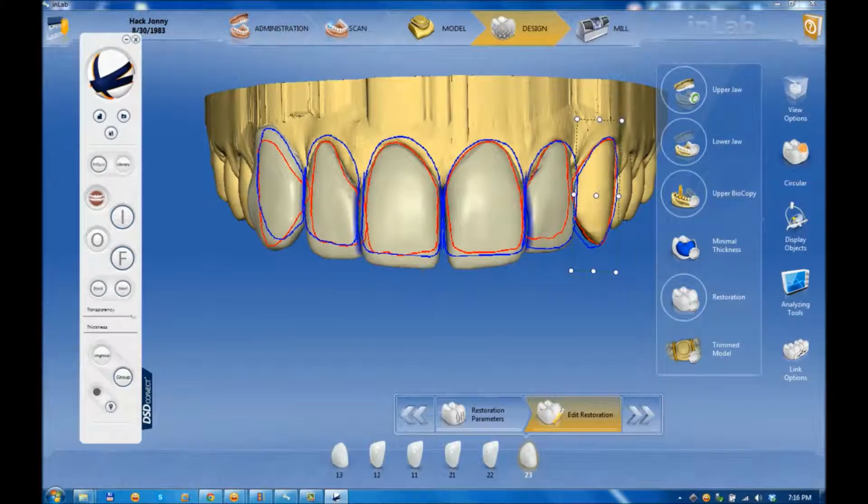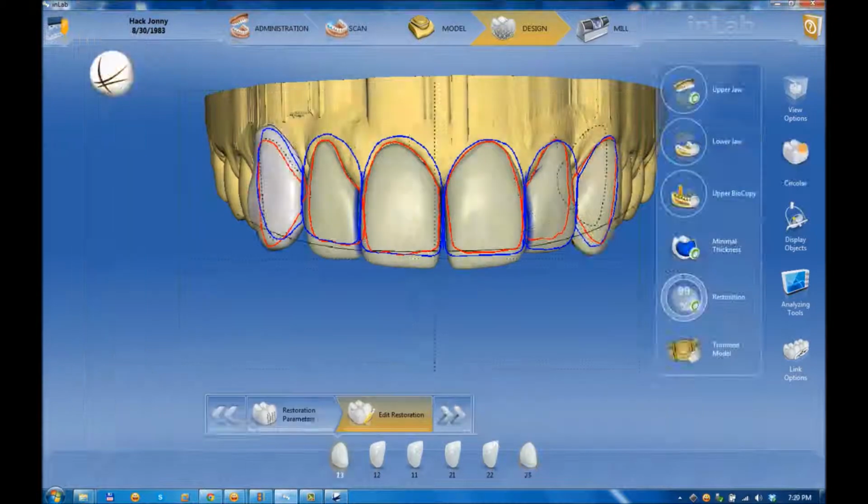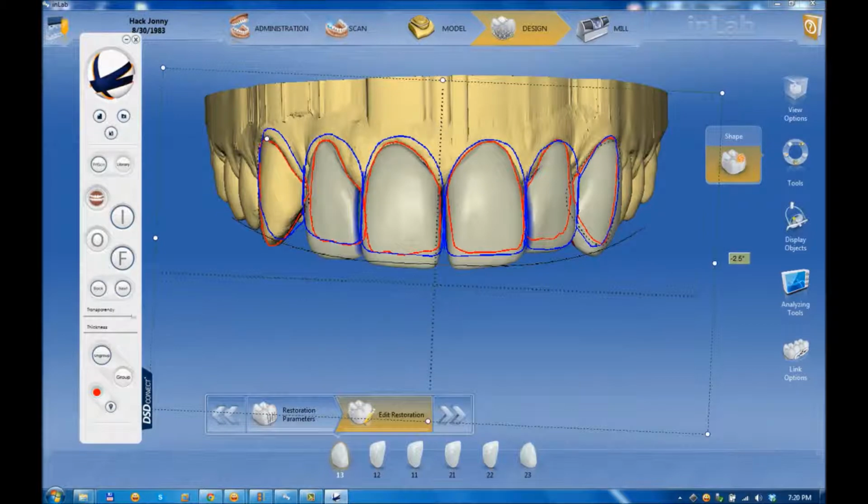After the teeth's individual design, you can verify it according to the facial axis and the incisal curve. Pressing the A key of the keyboard, the DSD image will appear on the screen. These will be calibrated also on the 3D model by matching the contours of the farthest of the teeth with the similar ones from the 3D model.